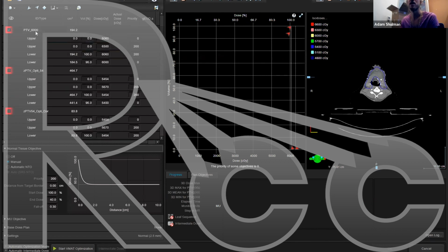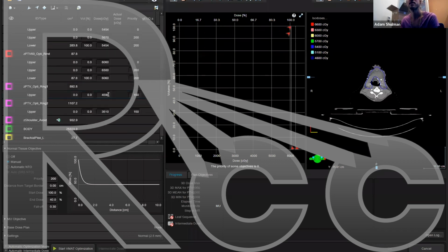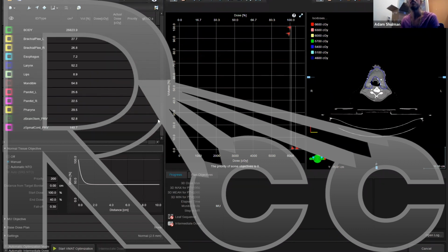And I put these objectives on all of my PTVs, so PTV 60, the Opti 54, the corners, the Rind for 54, the Rind for 60, and then I got my rings. This is 85% of PTV 54. This is 65% of PTV 54, as explained in the document. I got my shoulder avoid, and I put a no entry. In Eclipse, you have this. Again, there are other options. You can just weight it really heavily. You don't have this option in your treatment planning system. And I'm not going to put any objectives yet on my organs at risk. We'll get to that shortly.